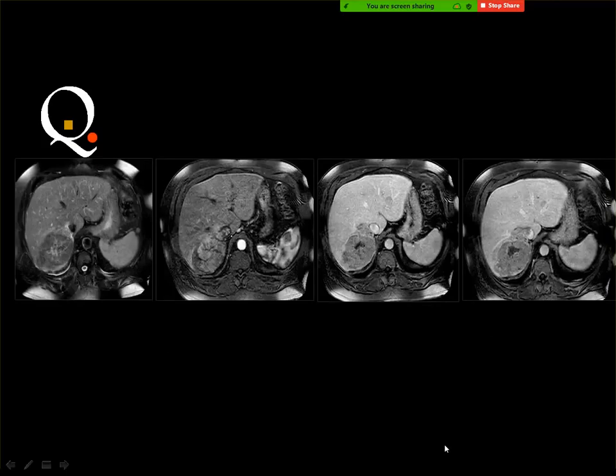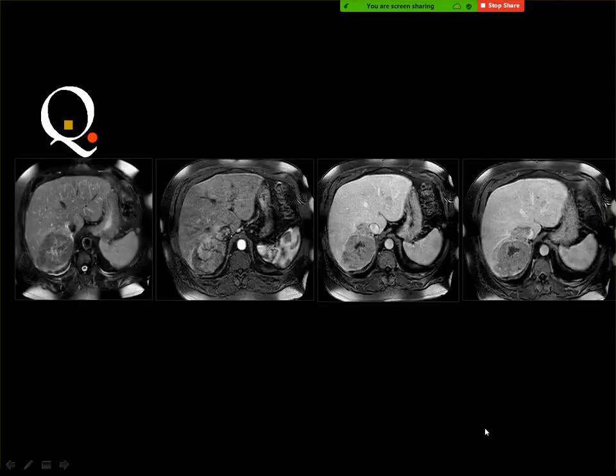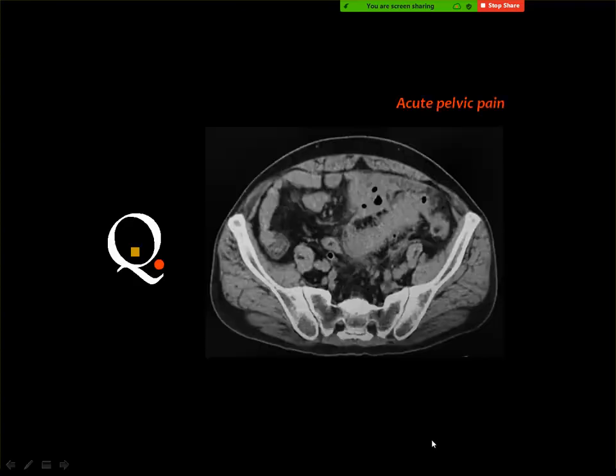What about the liver, doctor? This is the gallbladder fossa and some of the duodenal loop, but the liver is good. HCC, yes, and this is arterial phase with enhancement, washout, and delayed enhancing capsule, typical of hepatocellular carcinoma.